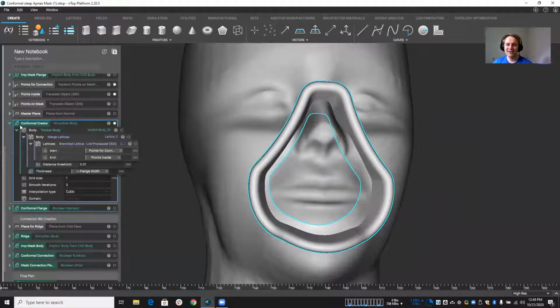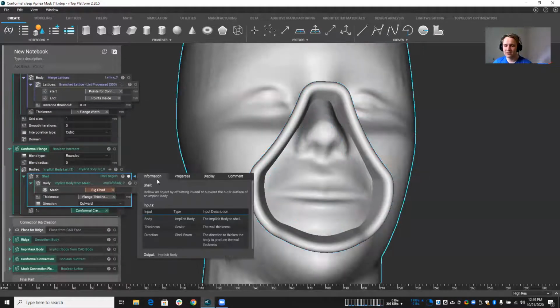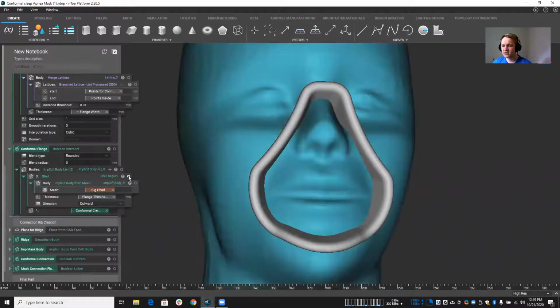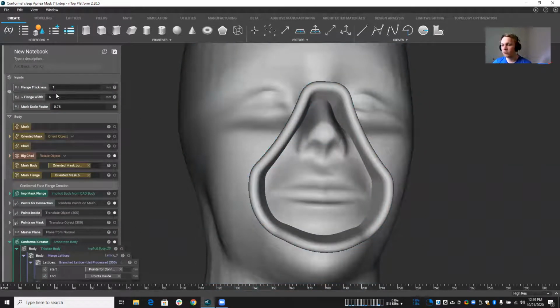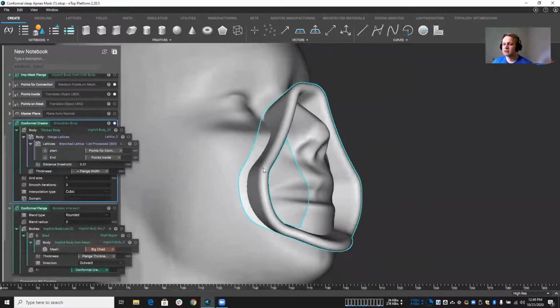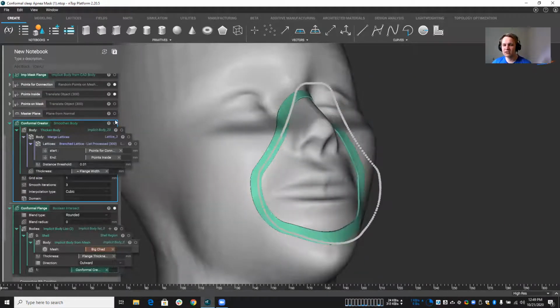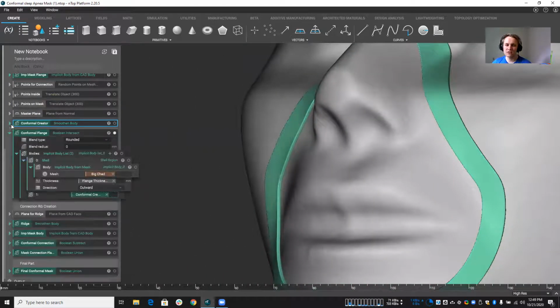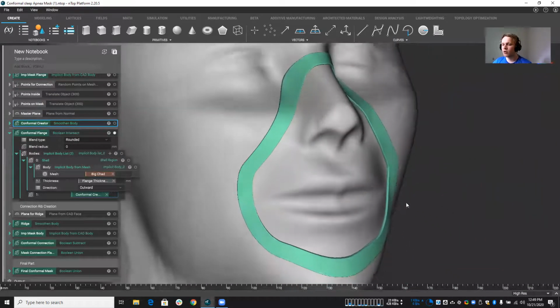Well, what I did was I went ahead and did a slight offset on Chad's face. And let me make this guy a different color for you. We'll take a look. So I did a slight offset here, just enough, just the thickness that I want this to be, which you can see here, my flange thickness is 1 millimeter. So nice and thin, 1 millimeter offset. And I intersect my nice geometry that I made with that offset face, and I end with this really nice conformal part along his face. I call this, you can see here, my conformal flange, right? That is difficult part number one.